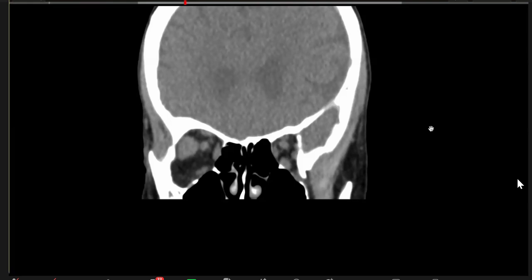Okay, you did very well, and then you went off on a tangent. Did you hear my history, by the way? It was a known case of breast malignancy and some thyroid related disease. Thyroid-related disease, I never said that. I never said that. So, okay, let me take over.